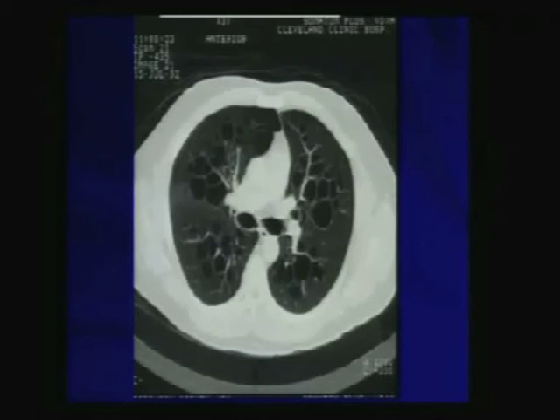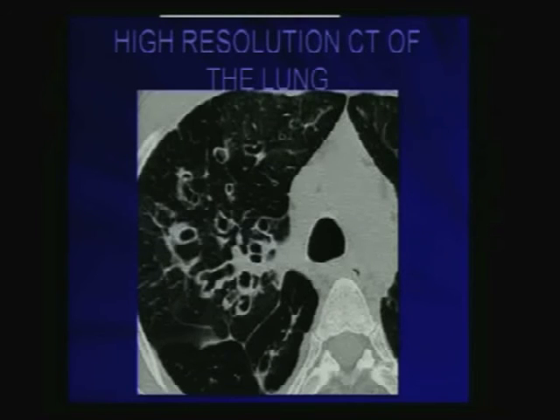We're talking about the bronchi being very dilated. Now, the other clue that you see here is this. This is tracheomegaly. So this is a typical patient with Mounier-Kuhn, when you have tracheobronchomegaly and cystic bronchiectasis. And one thing that we use CAT scan for is the diagnosis of bronchiectasis. And we look at the anatomy, looking at the fact that they can follow the normal bronchi, and that also they're obviously dilated.